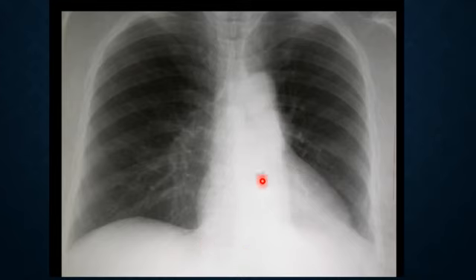Anyway, again, you can see here in this example, there is a triangular retrocardiac opacity. You can see the paucity of the pulmonary vessels on the left side compared to the right. Here it is less because the left upper lobe is hyperinflated, compensatory hyperinflation, and you can see that the heart has lost its waist. Okay, فقد خصره.